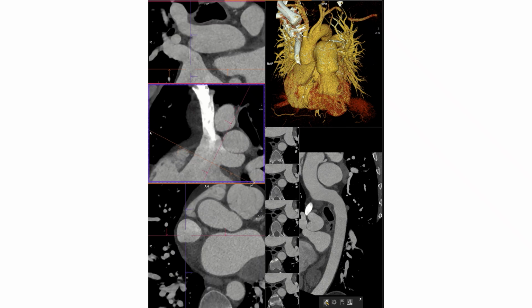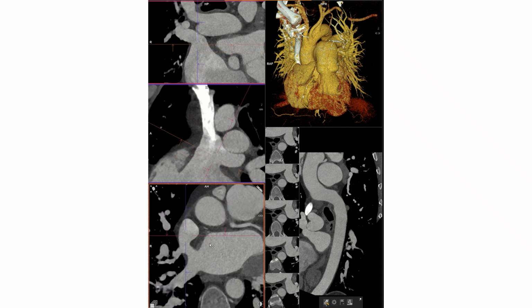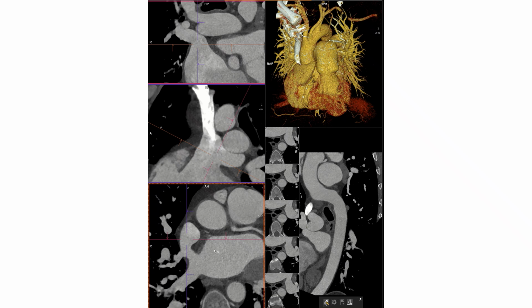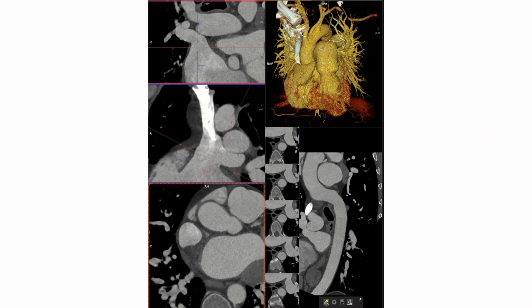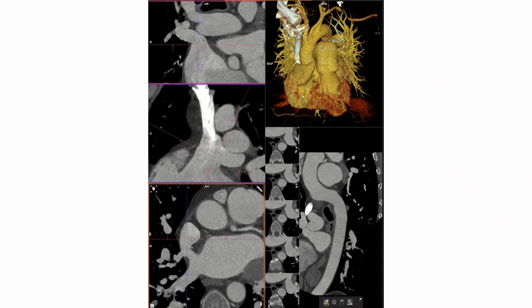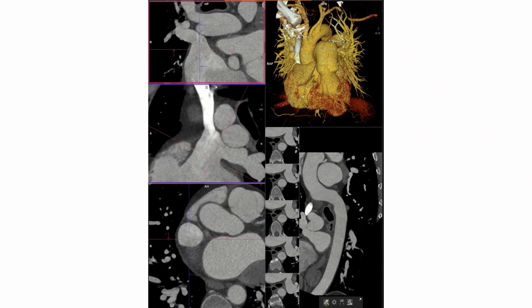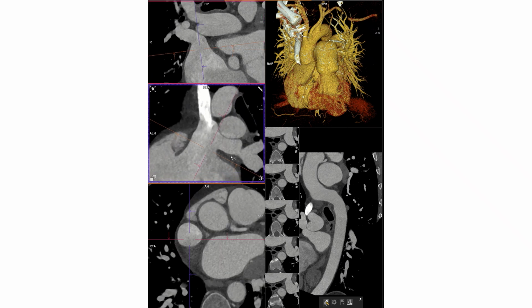And of course we need the distal landing zone, so that would give them the measurements to tell yes or no, and if yes, what would be the size of the stent to close it percutaneously. The proximal landing zone has to be just above the level of the highest partial anomalous. The distal landing zone is at the area where you could see the lips or margins of the superior vena cava junction with the right atrium, so that as soon as they close the defect, they would have a space where they could put the new stent or closure of the defect. We need to measure it, staying perpendicular to the margins in the two orthogonal views in order to get rounded margins of the distal, which is around 2.7.